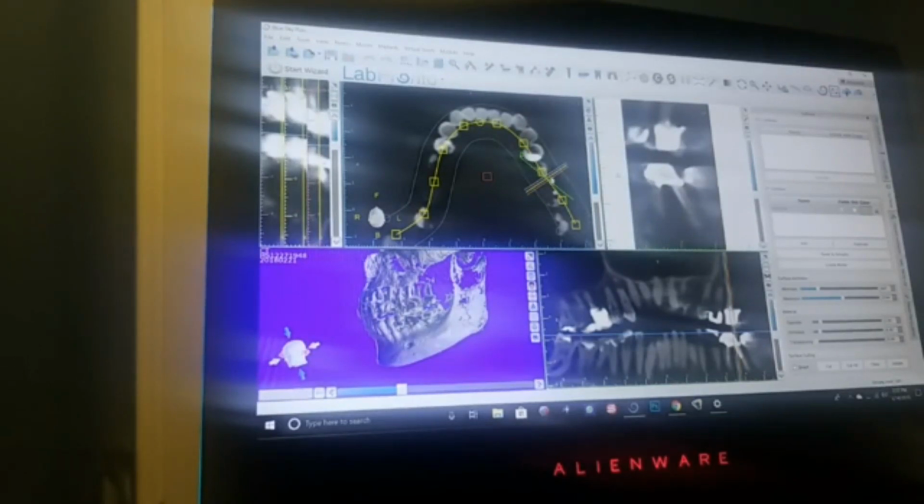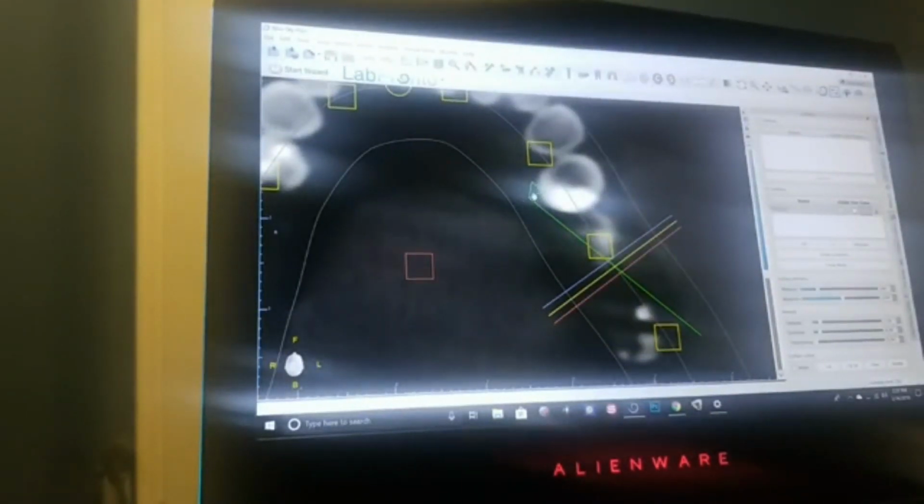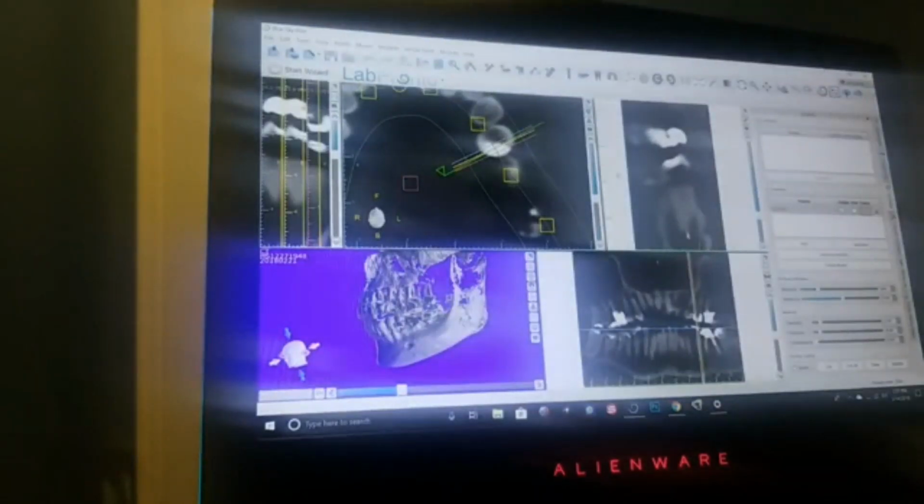Inside the axial image, where you have your 3 lines for cross-sectionals, you have this green line that's running dead center into these 3 lines. I'm just going to maximize that so we can all see a little bit clearer. So you have this little lever looking thing in green, and it basically runs dead center in this area. Now you could just rotate it around itself, and what this image is, it corresponds to this area here.